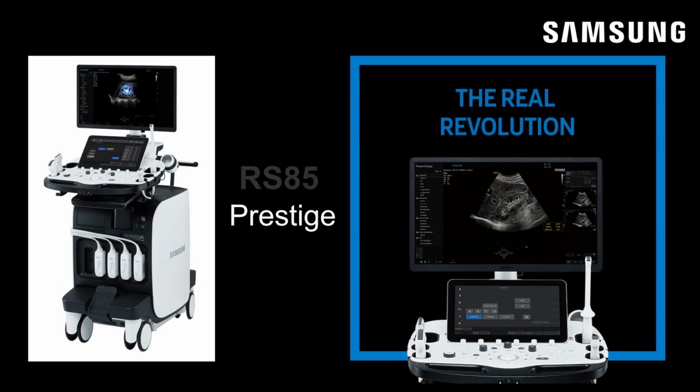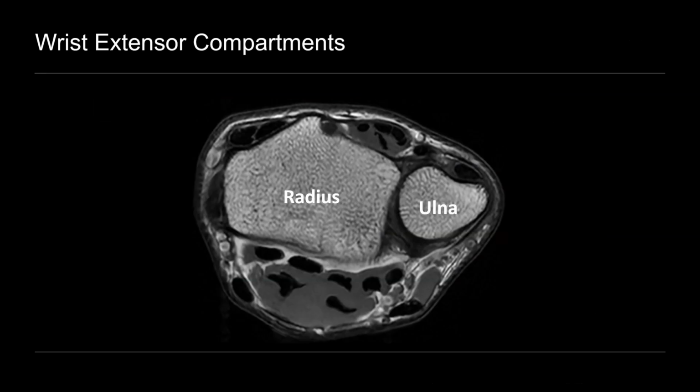We're going to review examples of both proximal and distal intersection syndrome, highlighting key teaching points throughout. Let's start with some anatomy of the wrist extensor compartments.